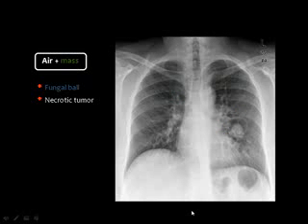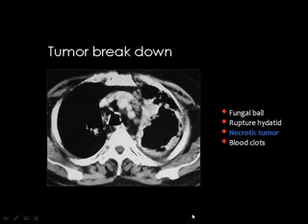Then what are the possibilities of a cavity containing a mass? The first possibility, the most common of all, is the fungus. Whenever you have a chronic lung cavity, the fungus may develop inside the cavity, and this is what we call the fungal ball, mycetoma, or aspergilloma. Then what happens if you see a cavity like this, and this cavity has a thick margin with an irregular inner surface? Then you know that this is a tumor. And if this cavity contains a ball, it will not make any difference in the diagnosis. This is a tumor, whether it contains a ball or does not contain a ball.